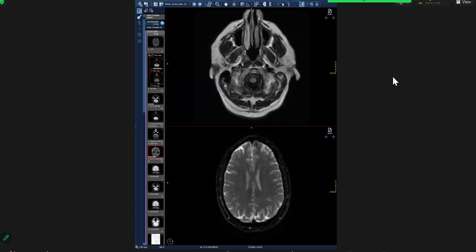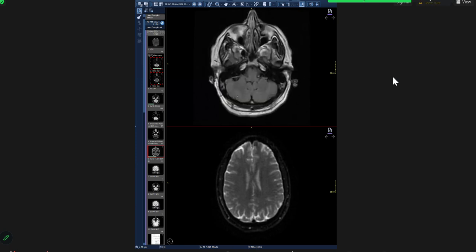What else? But I cannot see any cause except this hypointense signal. Exactly, exactly. So you want to see the cause.